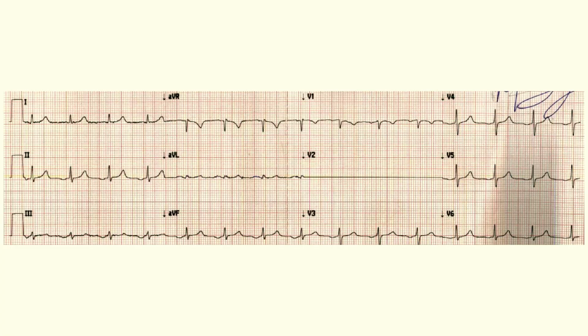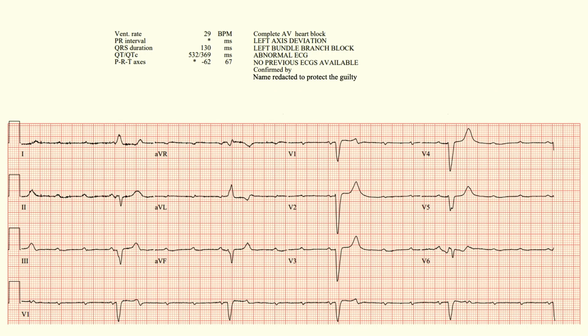Other ectopic things can still drive the ventricle. So that 1-to-1 is kind of a critically flawed heuristic, which will lead you astray at times that are really important. I'll give you another example. Someone tell me what the rhythm is here. And I left the attending read on, in case that's helpful to you.